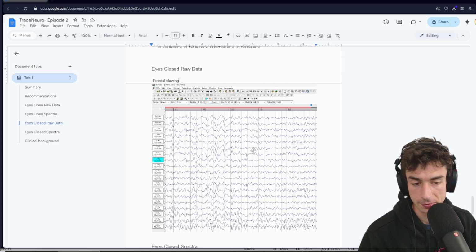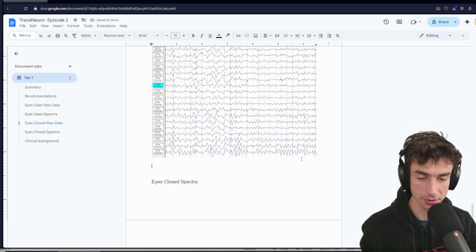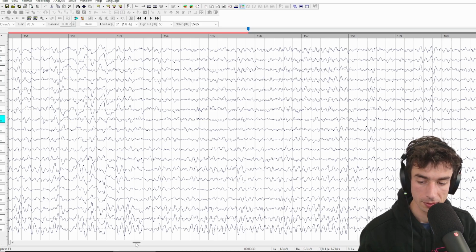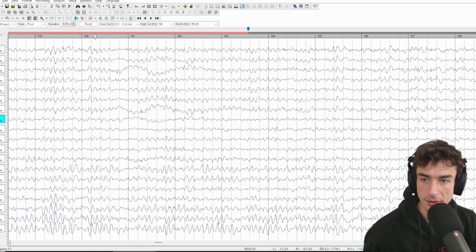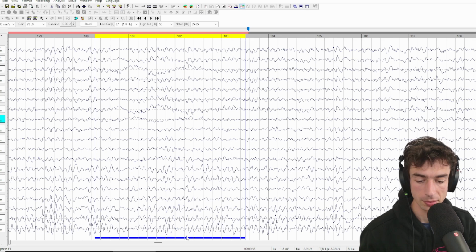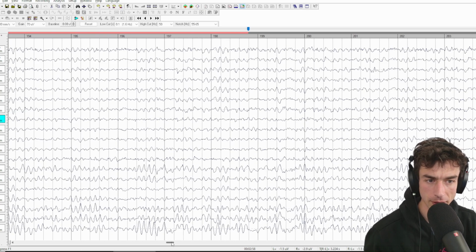Slowing is a natural phenomenon and also can be associated with transient ischemia or lack of blood flow, or like a brief metabolic disruption. This looks like some lateral eye movement that we didn't pull out, or perhaps cable sway, but more likely lateral eye movement.